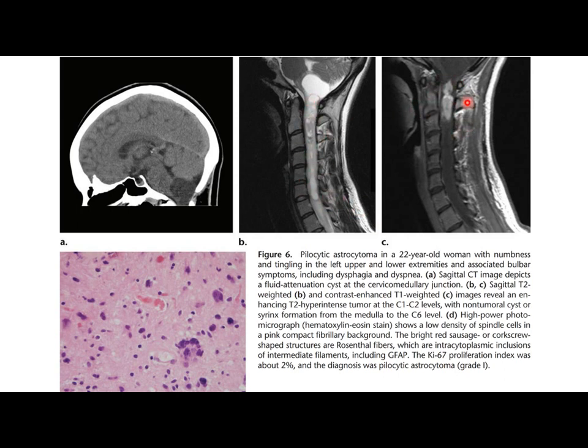This is the tumor. Okay? Yes. So this is where the surgeon needs to cut. This is just secondary to the tumor. And edema itself or infiltration? Edema and syrinx, not infiltration.